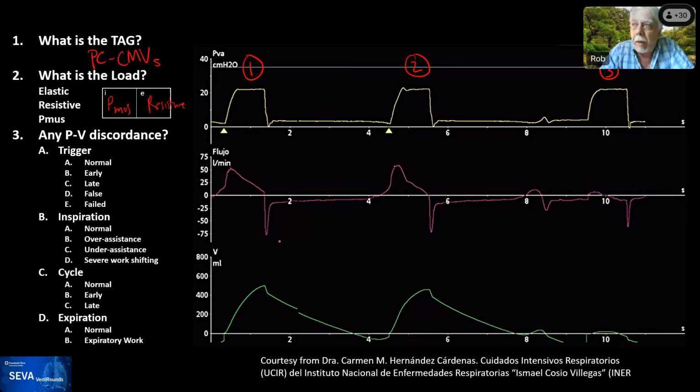What's happening is you're just exhaling the gas that was compressed in the circuit. It's a small volume. It was compressed in there under relatively high pressure. It comes out rapidly. And then once that's gone, the only flow is coming from the lungs at a very, very slow rate.